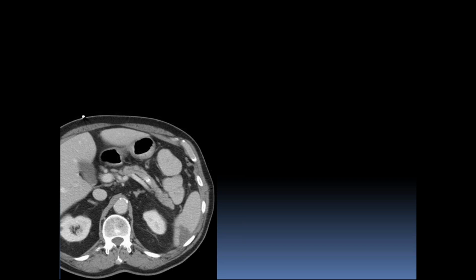So what I wanted to do is just a short little exercise on some pattern stuff. High-res chest comes down to pattern, location, and history. When we take a look at this one slice of the abdomen, you can see that the abnormality is in the spleen. And high likelihood what this is, it's an infarct, because that's what it looks like. So many things in the chest follow the same thing. You just have to learn to know the patterns.